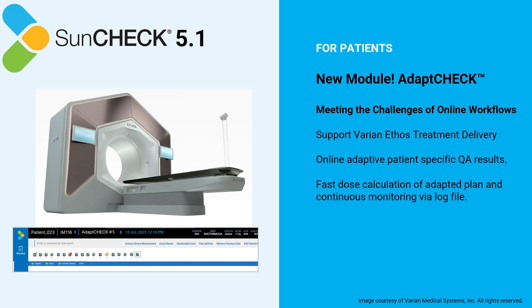So it replicates a lot of what we can do in SunCheck Patient, specifically on the Ethos machine. Due to a dedicated calculation server and some back-end work that has gone on, the calculation time is now under 90 seconds, giving you a rapid dose calculation for those adapted and scheduled plans. This means that you get the same quality from our collapsed cone superposition algorithm, but you get the results much quicker, which is important in that online adaptive radiotherapy environment.